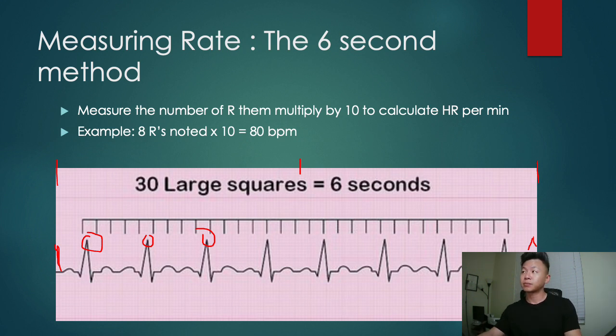Okay? So that's your intro into reading these basic EKG strips. Follow the next parts. In the next segment, we're going to be talking about how to distinguish your sinus rhythms, normal rhythms, and some abnormal atrial rhythms. So that's going to be what's in the next component. So follow part 2 if you want to continue this.